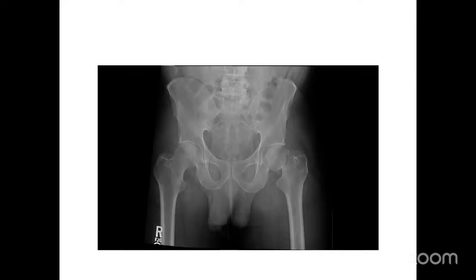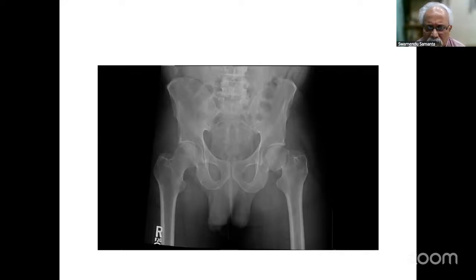You have to say: radiograph of the pelvis, AP view, of a mature skeleton showing the proximal part of the femur, where we see a displaced fracture of the left side of the neck, because you see this is a complete displacement. Then the theory, you can answer everything: how you classify the femur neck fracture, when to fix, and what the protocol is. So this is the way you have to tell.